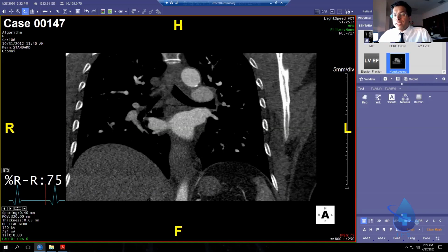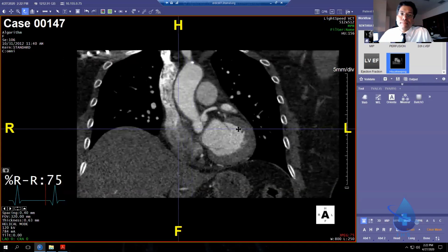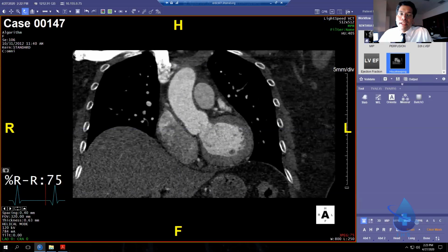There are 3 veins that are visible in the thorax in almost everybody on a CT scan: IVC, SVC, and the azygous vein. So let's point those out. SVC is usually pretty straightforward because contrast is being injected. That's SVC.